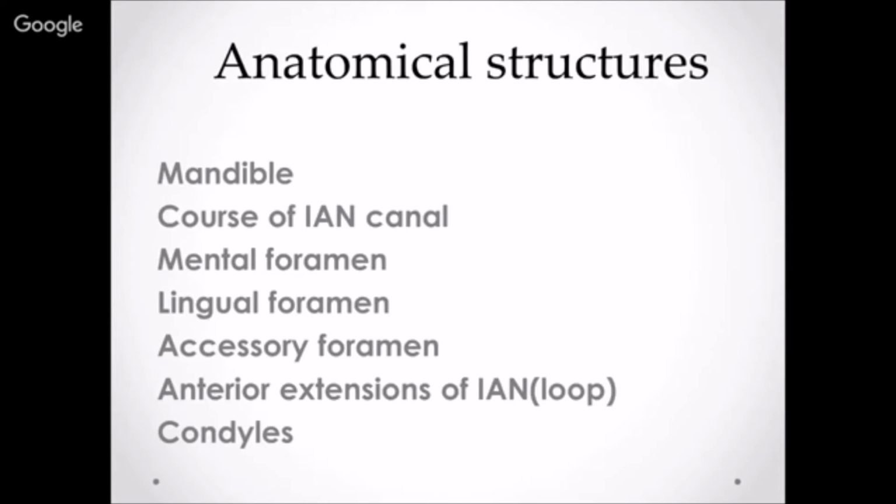Accessory foramens. Now, accessory foramens may not be typically visualized in every single individual's jaws, but literature indicates a good over 30% of all individuals do have accessory foramens. You would not particularly be looking for accessory foramens, but in case you come across one of them, it's probably around the mandible, around the premolar canine region. So it's very critical to keep an eye out for any accessory foramens that could come out of the normal anatomy as well as a variation.